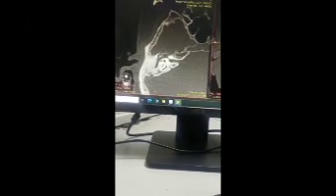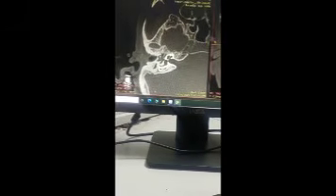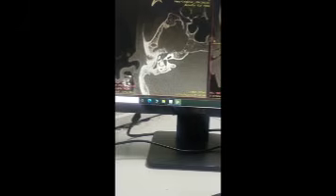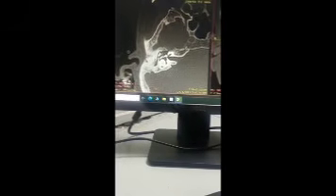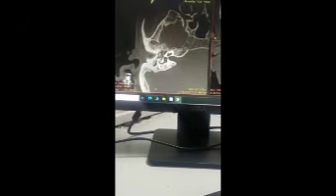Here too you can see the basal turn of the cochlea, and this is the vestibule. This ring-like structure that opens into the vestibule is the lateral semicircular canal. You can see the ring appearance of the lateral semicircular canal. Here is the malleus, and below the malleus is the incus, and the lateral semicircular canal.